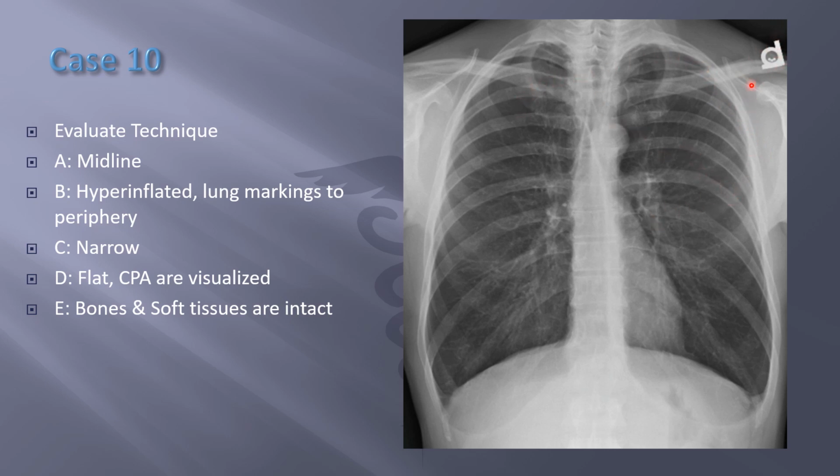Now there's also this little circle thing, which is a level. These little beads in there, if the patient's sitting upright, will level at the bottom. If the patient was laying down on their back in a supine position, it'll be like a little triangle shape in the middle here. If they were laying on their side, it'll be layered out on the side, so you can tell this is like a little level.